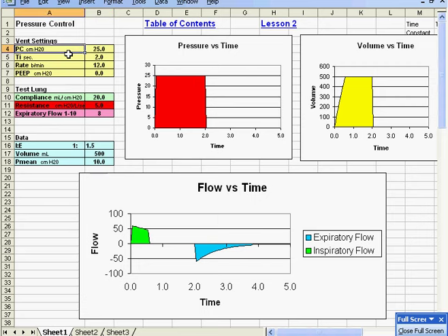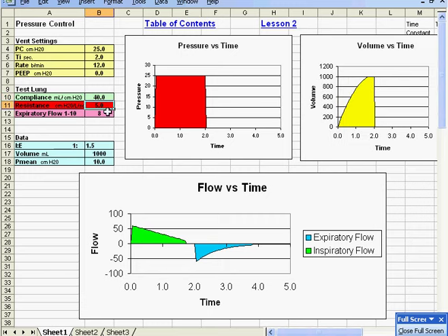We didn't change our delta P, but the volume that goes into the lungs drops dramatically. Decreased compliance during the mode of pressure control results in a lower volume delivery. If I decrease the compliance even more, you'll notice that the volume being delivered gets smaller and smaller. If I increase compliance, making the lungs more distensible, the amount of volume that goes into the lungs becomes greater.